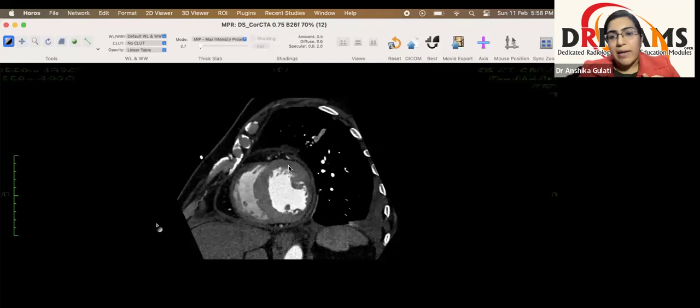So all these functional calculations we can do on the short axis images. And what else? We can calculate the wall thickness of the left ventricle. We know that normally in the systole there is contraction of the heart, which leads to thickening of the wall. And if this thickness is more than 15 millimeters in end diastolic phase, then you can diagnose hypertrophic cardiomyopathy. Or if there is thinning, focal thinning, for example in this case here, then you can diagnose cases of myocardial infarction. This is about the still images.